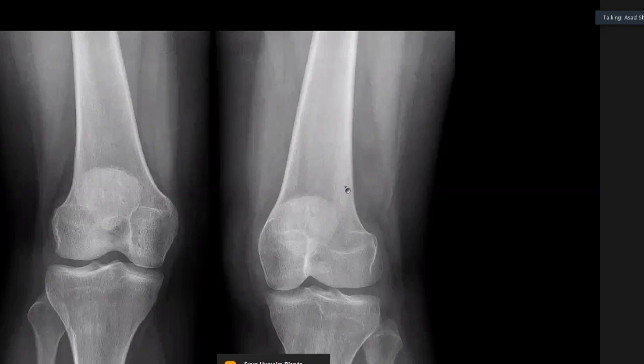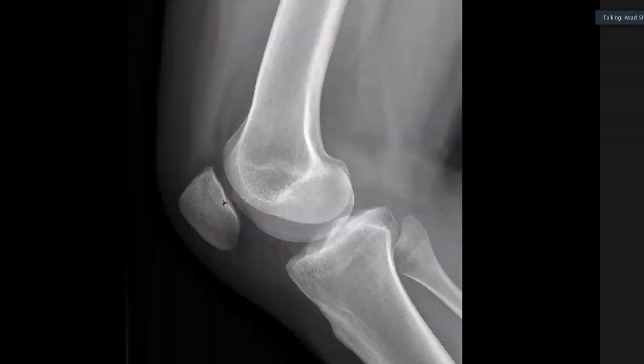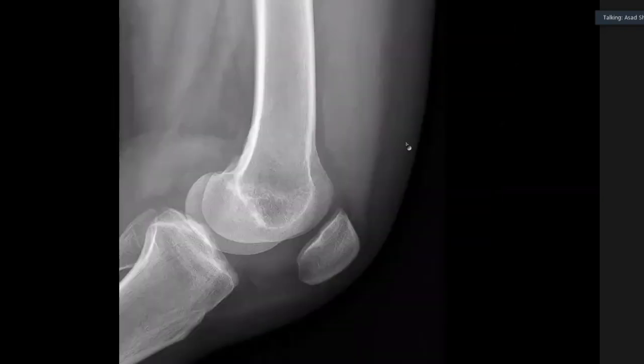Okay, probably. I'm not convinced, but yeah, okay. But all of you should appreciate there is this kind of abnormal soft tissue here. It's a bit subtle, yes, but I think when you start comparing, then you notice there is something here which is not normal. Yes, in the background, you would like to see a lateral of the left knee, wouldn't you?